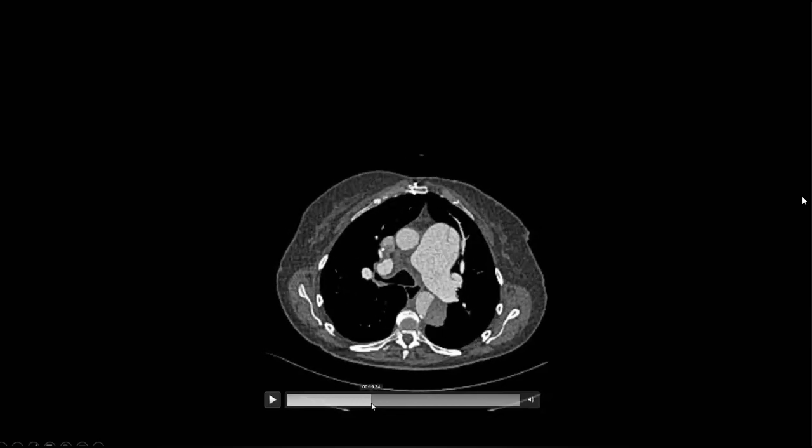This is my first case of main pulmonary artery dissection. This is very rare and no one knows what to do about it. The professor of cardiothoracic surgery with whom I report said that this is his second case in his career, and that is almost 40 years. So this is main pulmonary artery dissection as well, and no one knows what to do about it.